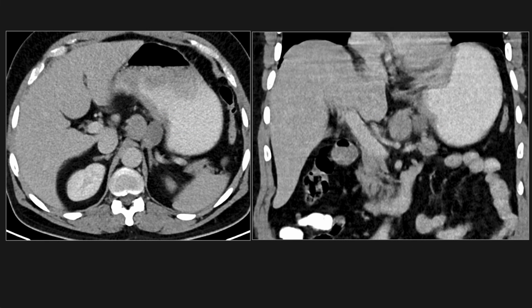Well, we don't have to scroll very far in this case to help us sort it out. Scrolling a bit inferior, we spot these two huge gastrohepatic ligament lymph nodes, which support a high suspicion of gastric adenocarcinoma, which was confirmed in this case.